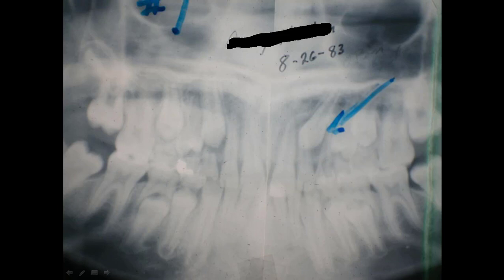And if you look at it very closely, you can see the outline of the lateral on the crown of this permanent lateral right here. And you can see the shape of it. Let me erase that and look at it close, and you can see the lateral root shadow of it in the x-ray there, right in this area.